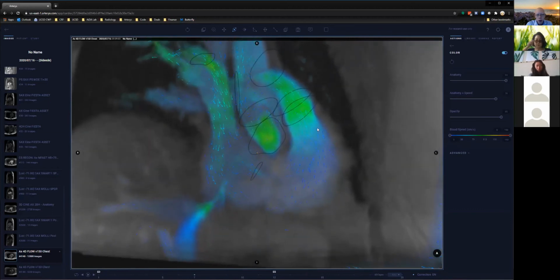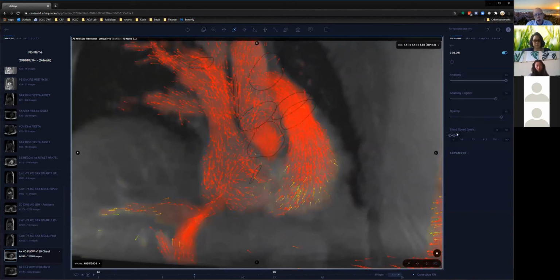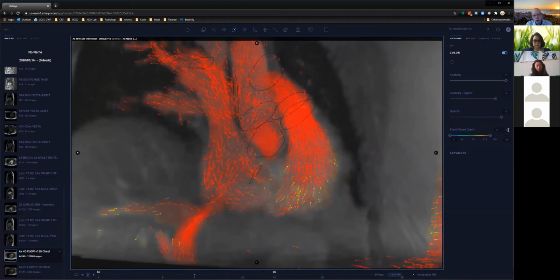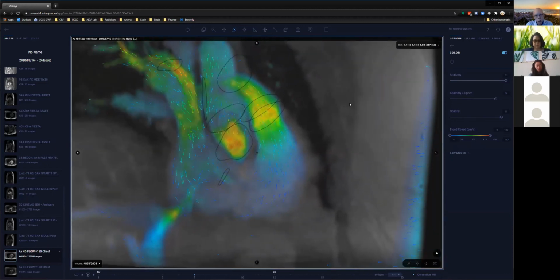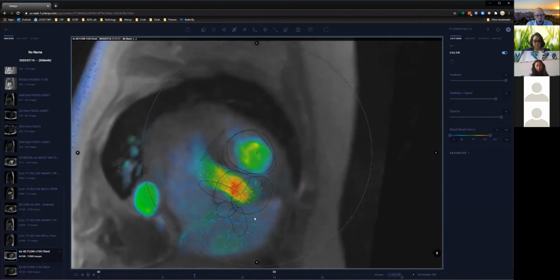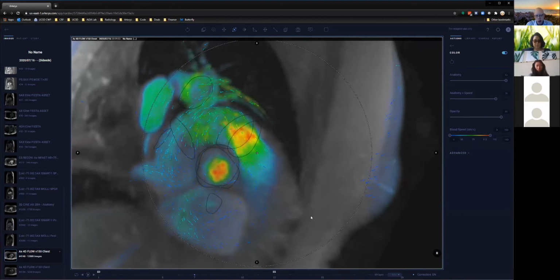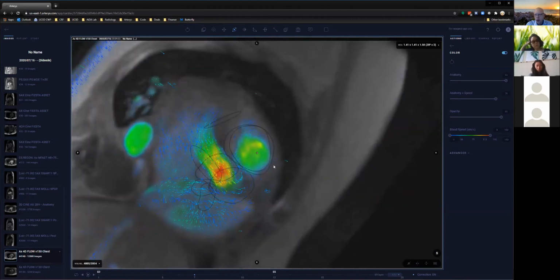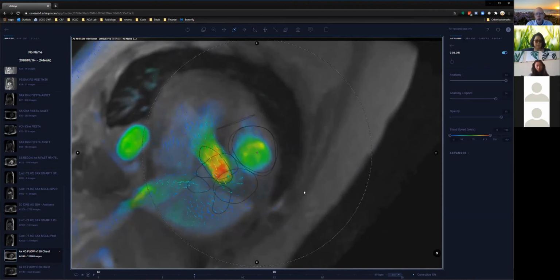when you look at the pulmonary valve flow, oops, not that, that's too extreme. You'll notice that there's about twice as much volume coming out of the pulmonary valve, and you can visually get a feel for that compared to the aortic valve. The aortic valve is this big, and the pulmonary valve is this big, right? It's a lot bigger. About twice as much volume is coming through it. You can guess that the QpQs has this too.